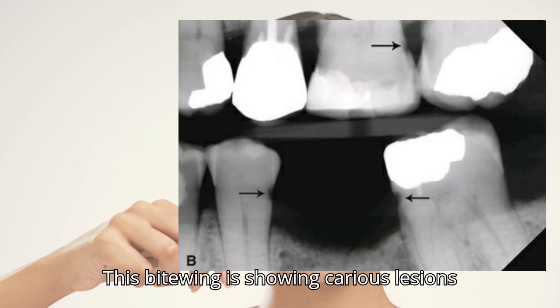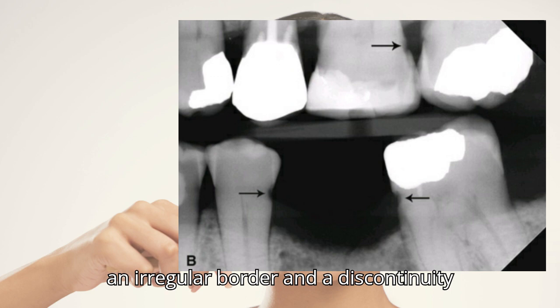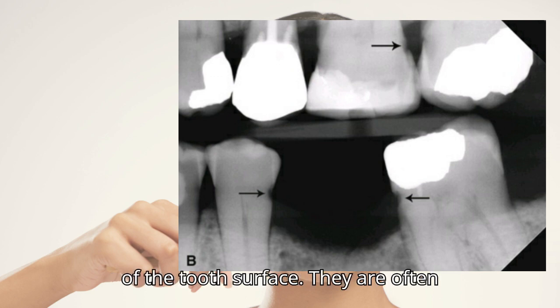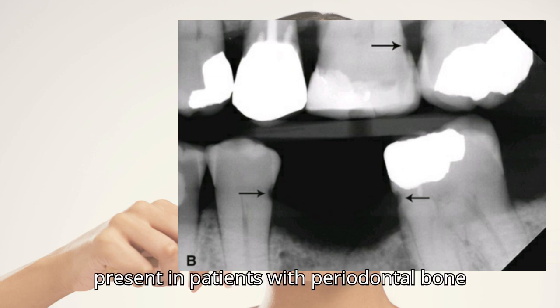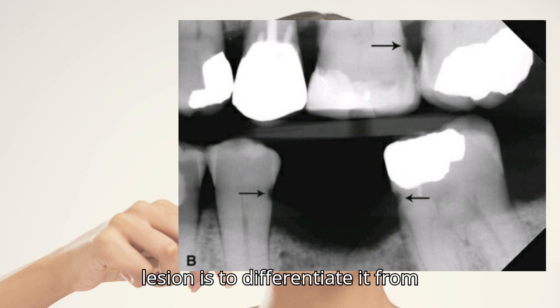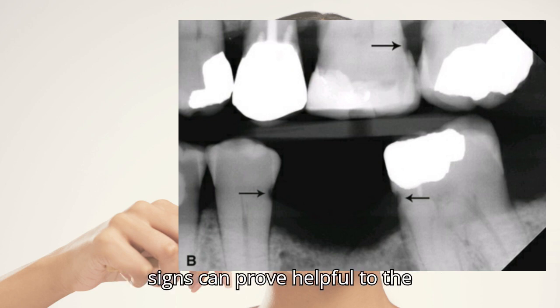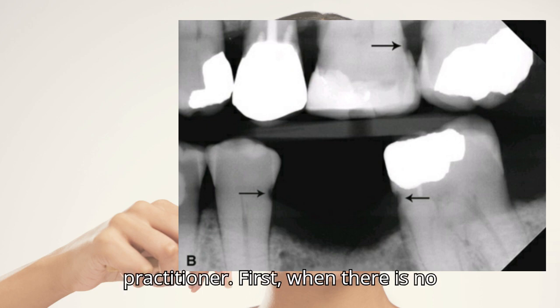This bite wing is showing carious lesions, which, compared with burnout, demonstrate an irregular border and a discontinuity of the tooth surface. They are often present in patients with periodontal bone loss. The difficulty with a root caries lesion is to differentiate it from cervical burnout. Some radiographic signs can prove helpful to the practitioner.